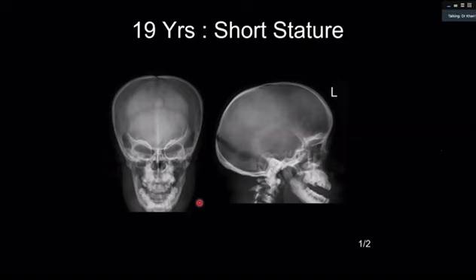Of course, because of projection, it might not be visible to you, but look at the bone density. There is a bit of sclerosis. Look here at the base of the skull, and you will appreciate there is a bit of sclerosis. Look at the orbital margins, and they are all sclerosed. Bone density in the exam is always slightly difficult to pick up at times because of projection, but the examiners are going to help you.